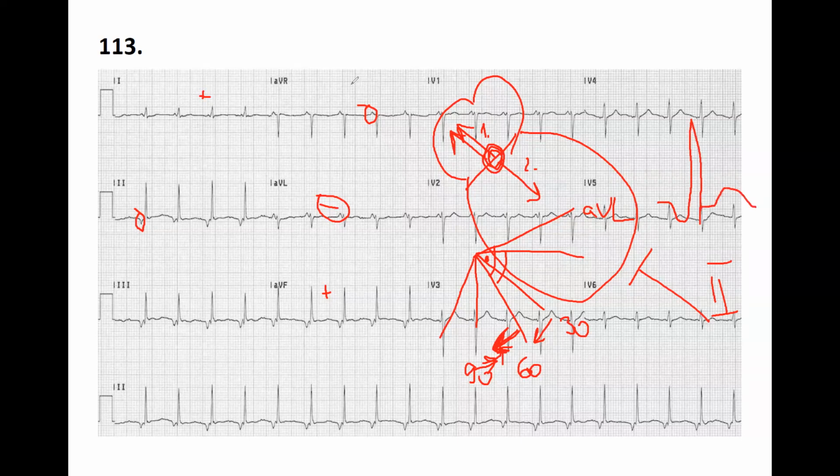In opposite, in AVR, pardon me? Sorry, how do I differentiate between the supraventricular and the junctional? I was a bit confused on that. Supraventricular and junctional, the same. Supraventricular means everything above the ventricle, including AV junction, atrium, and sinus.